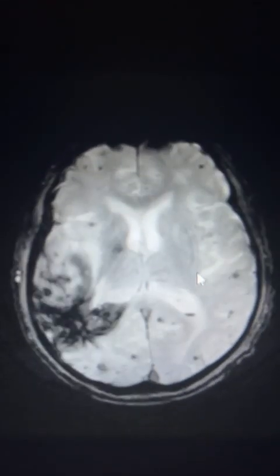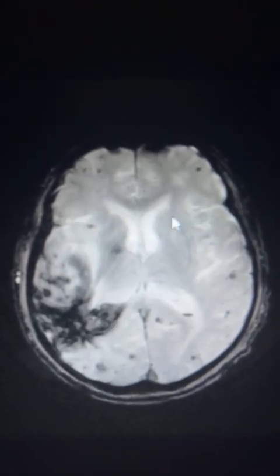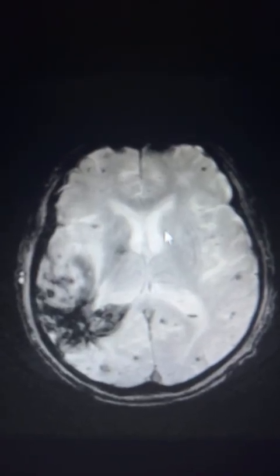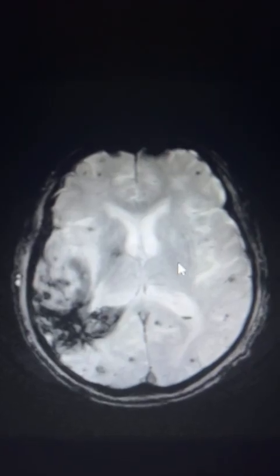Whenever you see those and you're thinking about hemorrhage, you have a few possibilities, but the two practical ones would be either due to hypertension or due to amyloid deposition. When it comes to differentiating such deposits, in the case of hypertension versus that of amyloid, if it's the more common hypertensive abnormality, you'd expect to see these dark spots within the center of the brain more deeply, typically within the basal ganglia or the brain parenchyma surrounding that, which makes lots of sense because these are very common areas when it comes to hypertensive changes and hemorrhage and others.